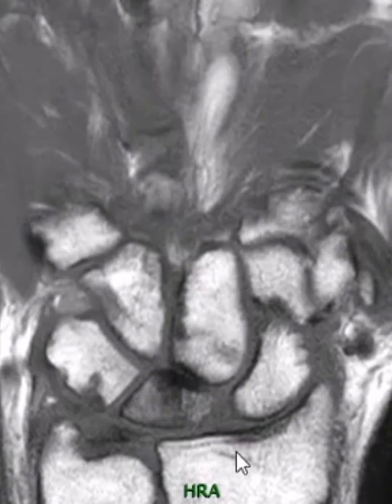We see the capitate here has migrated proximally, but only a little bit. We see this often when the scapholunate ligament is ruptured, and the joint is widened here, and it can migrate down. It may be partially torn, or it didn't look like it was ruptured, and it wasn't really wide, but we can't say there's a complete loss of joint spacing between the lunate.